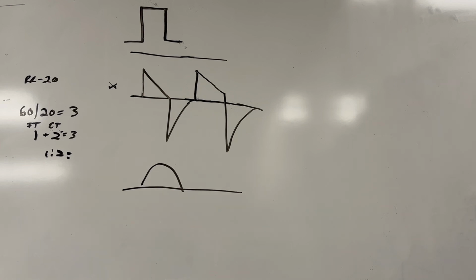So, what does that tell me? If we're not able to reach zero flow and we're at the 1:1, 1:2 ratio, what that gives me an indication of is that our patient's lungs are compliant, because they're letting me know that they're still trying to move when the inspiratory phase is going on. So before you see this and go make changes to your I time to try to get the patient to reach zero flow, double check your I to E ratio. Make sure you're not too close to a 1:1 or 1:2 ratio, and that your patient isn't just really compliant.